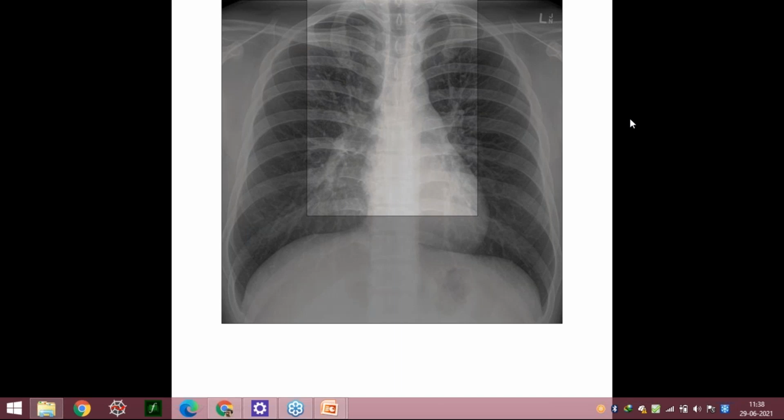Okay, if we look at this X-ray, the highlighted part is showing the airway. Are you able to follow my cursor? Yes, we are. Okay, fine. So this is the trachea that is to be seen. This is the division of the trachea into two main bronchi, the right bronchus and the left bronchus, and this angle is the carina. So this is what the airway constitutes. This is what you are supposed to see when we say A of the chest X-ray.